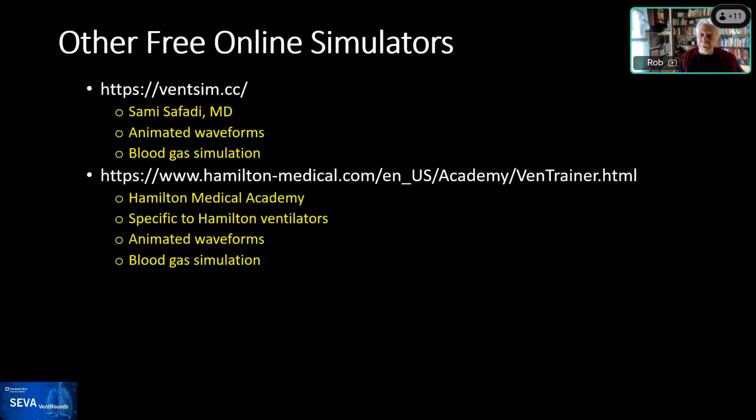You get animated waveforms like we've just shown you, and blood gas simulations, like end-tidal CO2 and saturation, and you can change the patient's disease states. There's a wealth of information, but these are not generic ventilators. These are specific to Hamilton. They have done a lot of great work, and I believe it also will run on your phone as well.